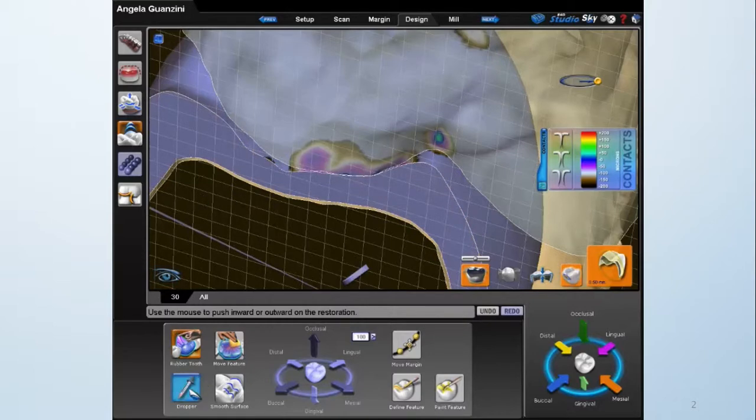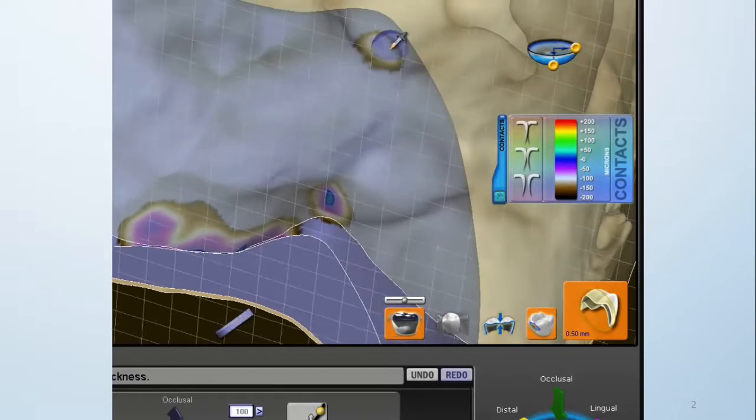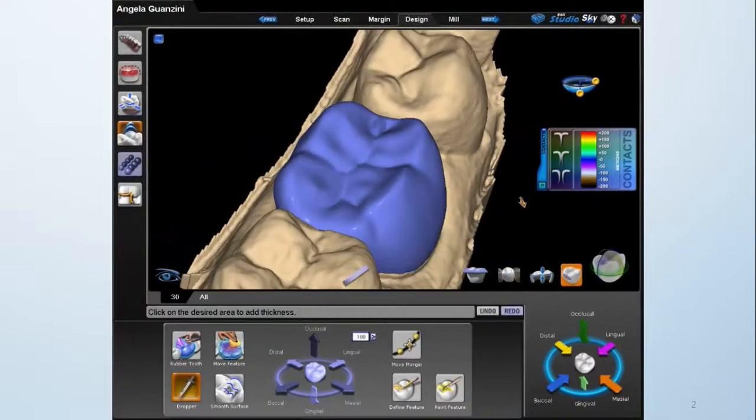So utilizing slice plane. And now dropper. How many of you have used dropper in the negative? Look at the number. The number that got cut off at the top of the screen is actually negative 0.03-ish. That is what I dropped it down to. So dropper can be used in the negative, meaning instead of waxing on and using dropper as an adding material, it's removing it. And it removes a very, very little amount.